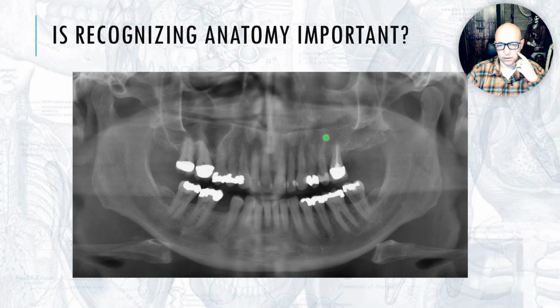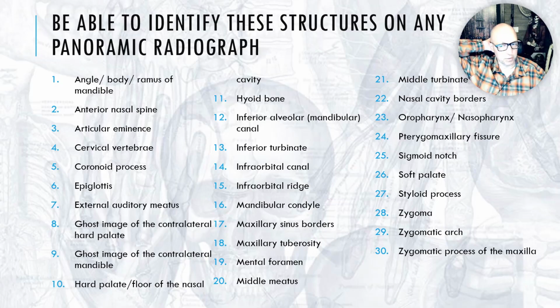And is this concerning, or should we just ignore it? You know, we're tooth doctors. We don't deal with this type of thing. I don't need to do anything about it. This is a squamous cell carcinoma of the maxillary sinus, which destroyed the borders of the sinus. Very important to recognize, very important to point out, have them get this checked out. Patient should see an ENT without any delay. You know, potentially you could be saving someone's life.